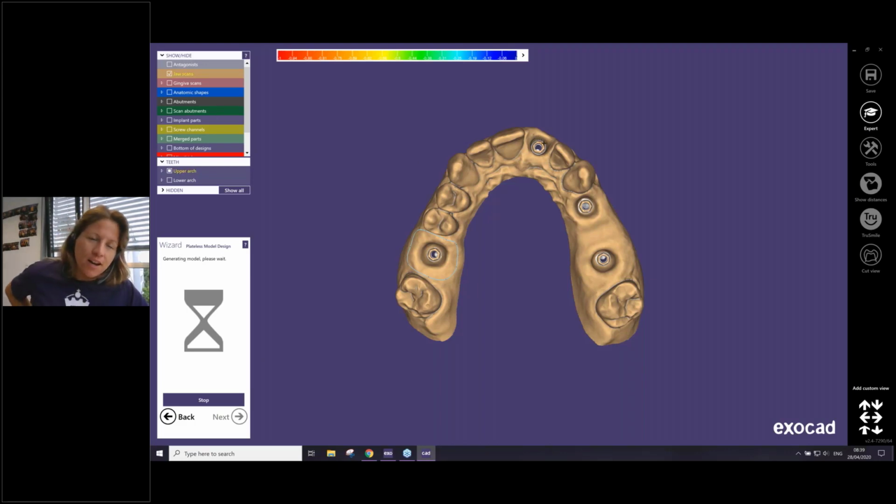That means the software will generate an abutment die out of the abutment shape, and you don't need an analog. Maybe the abutment is already designed, already in the mouth, and something was happening with the crown on top, and you have done it before, maybe one year before. You can reopen this one, and you can generate one die out of the abutment, and then you can continue with the crown design, for example.